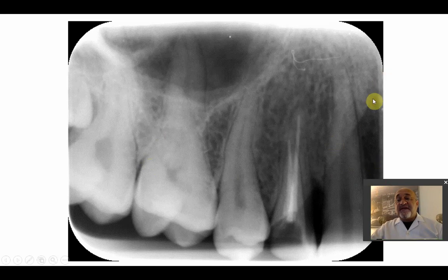Another radiograph which shows clearly the naso-labial fold, this line over here. This one. See, this is soft tissue, of course, of the cheek, because the cheek becomes thicker here, and this one has a reduced thickness, so it allows more X-ray to pass, thus it will appear more radiolucent. Compare it to this one. This is again the line which is demarcating the naso-labial fold.